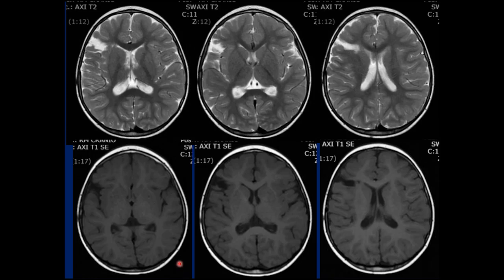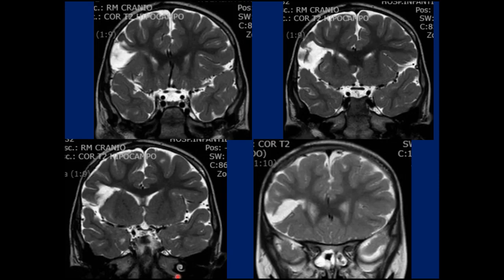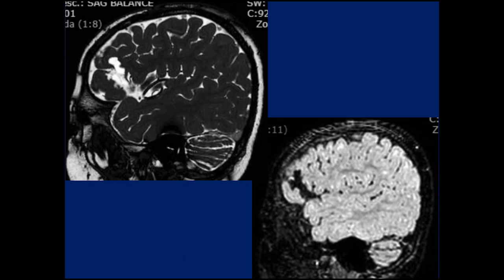And here we have the postoperative MRI showing the total removal of the cortical dysplasia. You can see how close we were, very close to the frontal horn over here. Here we have a T1. You can see the distance. Here we have the postoperative MRI, coronal cut showing the total removal of the cortical dysplasia. And once again, you can look how close we were in relation to the frontal horn. More postoperative coronal MRI and the sagittal cut of the postoperative MRI.